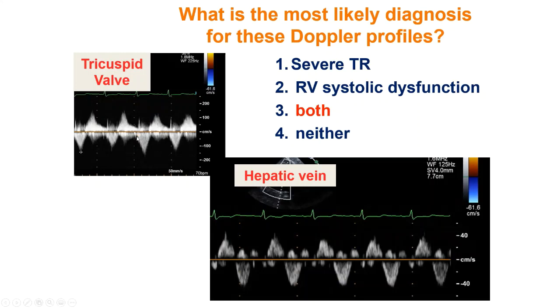Again, this is a tricuspid regurgitation signal. The normal signal should be parabolic. This is triangular. My colleague Brian Gentile says at UMass triangles are never good in Doppler, and that is true. This is triangular because the ventricle takes time to reach its maximum pressure and therefore maximum gradient, and there's a cutoff because the right atrial pressure has risen significantly.